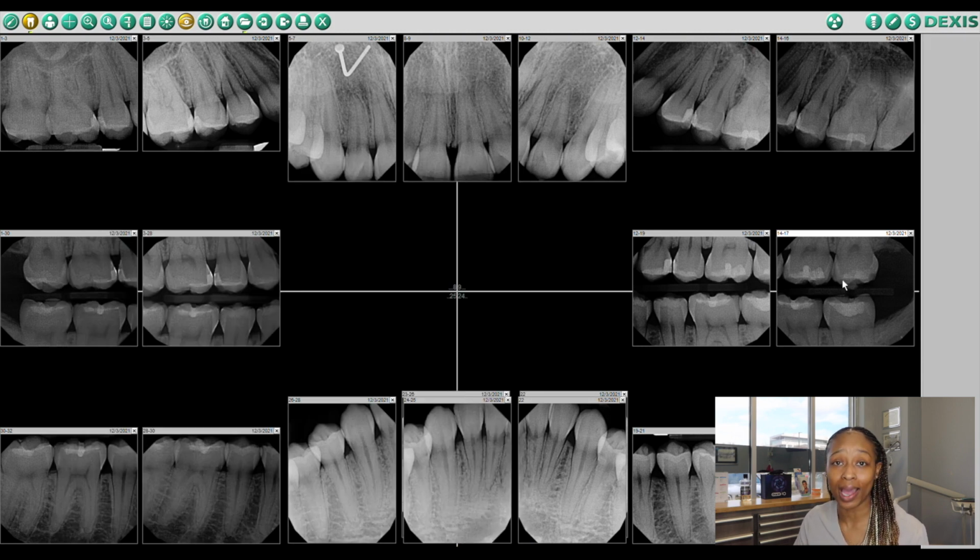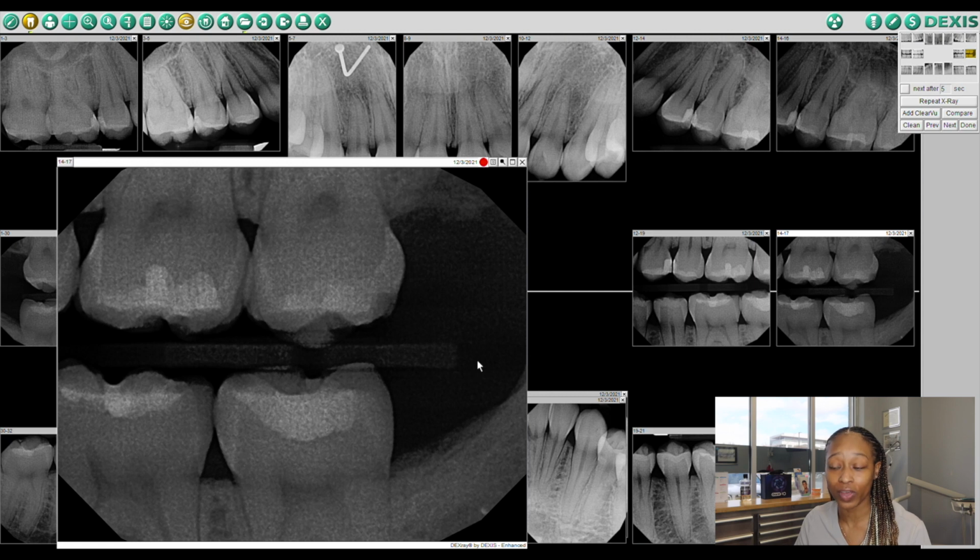We can stay on this bite wing X-ray, no need for moving. On the lowers, you usually see a lot of buccal pits on the cheek side. You see a lot of cavities there, so usually on the lower, it's a buccal filling when it goes this deep. So I'm gonna put an OB for number 18. Remember, 17 is missing. So number 18 is an OB.